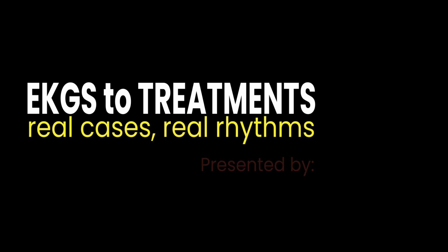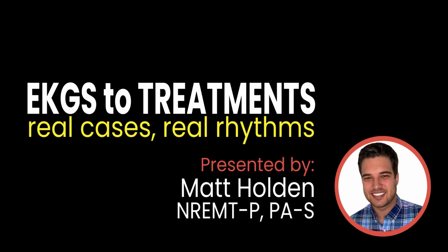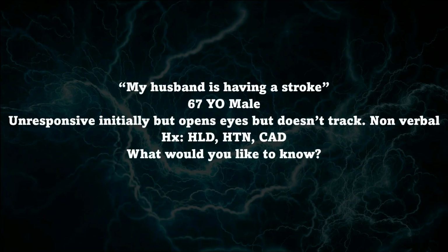I'm going to go over some real life patients I had as a paramedic and while I was in the hospital, and we'll break down some of their EKGs and run through these scenarios. So first off, we're going to start with a 67-year-old male with quote-unquote stroke-like symptoms per his wife.